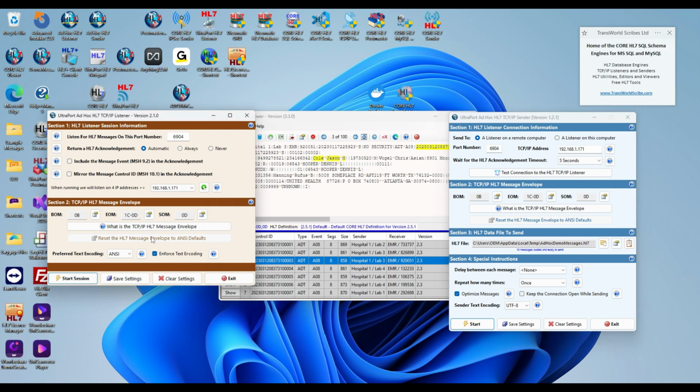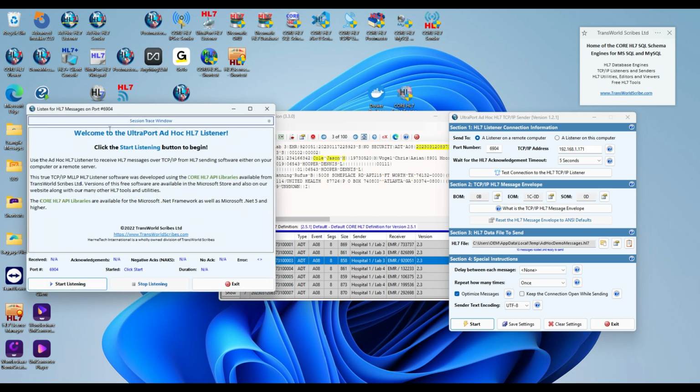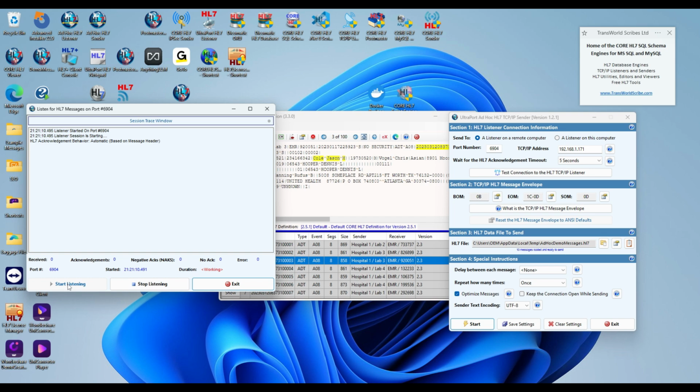Here's our listener. All you have to do is put in the port number that you want to listen on and click the Start Session button. That's 99.9% of the time. That's all you have to do. Then you click Start Listening and it's working. Next, at this point you give somebody the port number 6904, and your computer's IP address if they're on a remote system sending in to you.